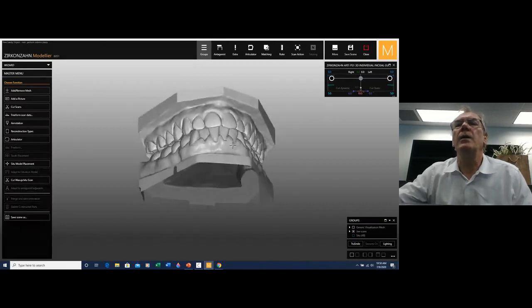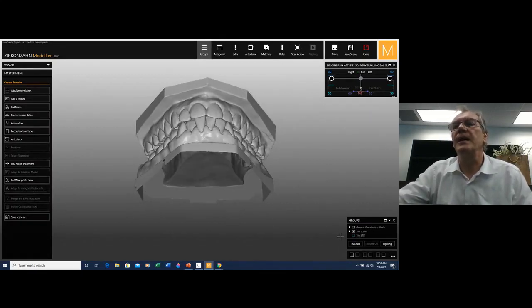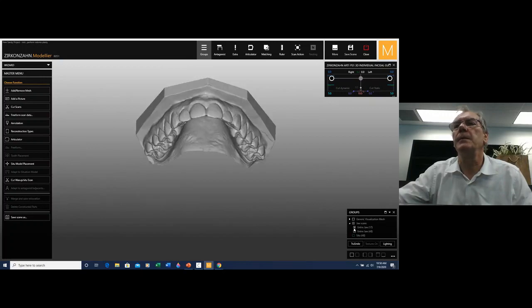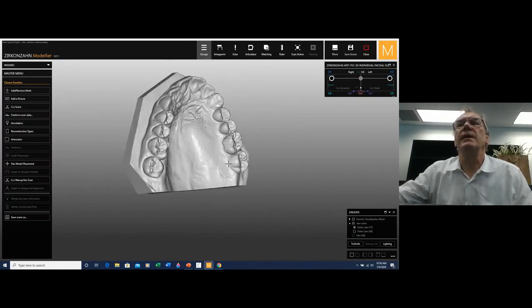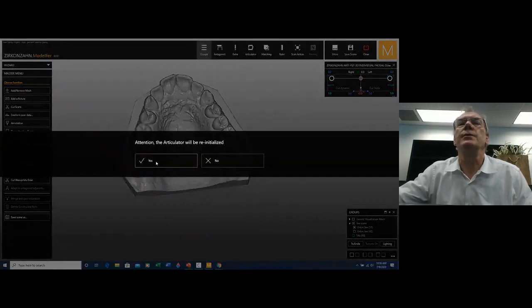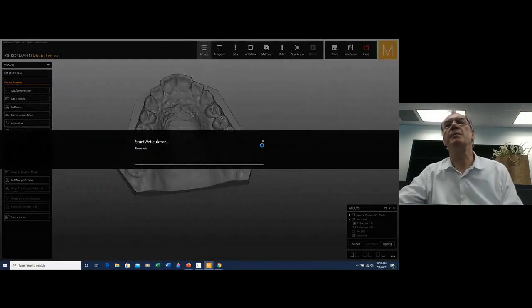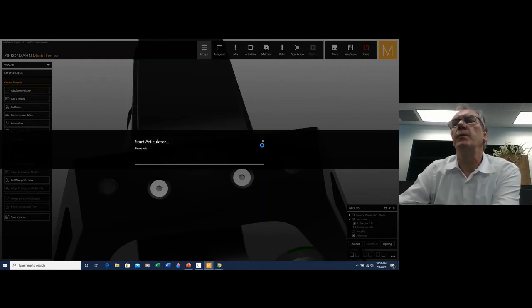So we are now going to set the same movements with the custom data of the patient. Let me bring up my model. Here we are. So we have actually set it to the values produced by the Plane Analyser. Just let me open it up quickly so I can show you that.